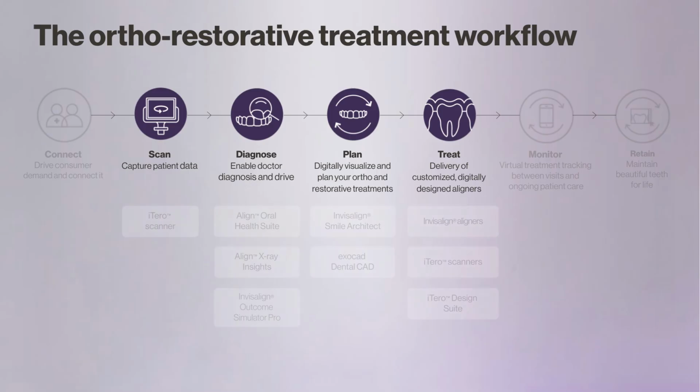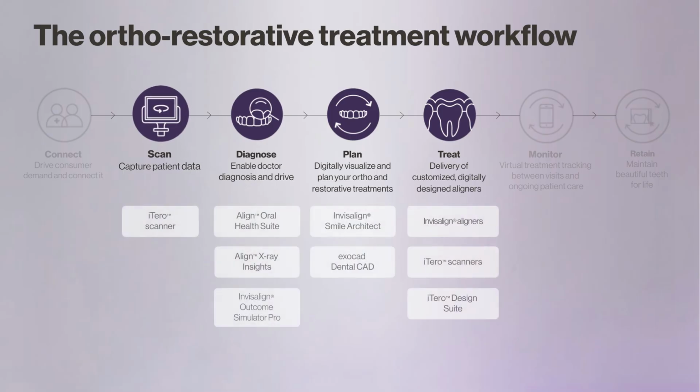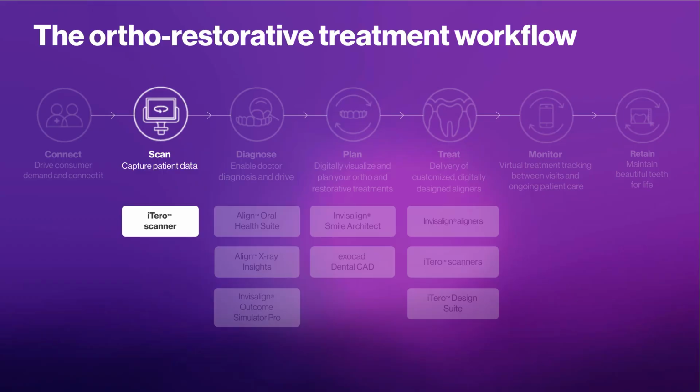Now that we've seen the value of pre-restorative alignment, let's look at how it fits into a complete workflow. This end-to-end process connects scanning, diagnosis, planning, and treatment, supported by digital tools at every stage. Let's discover each step in more detail, starting with scanning with the iTero scanner.